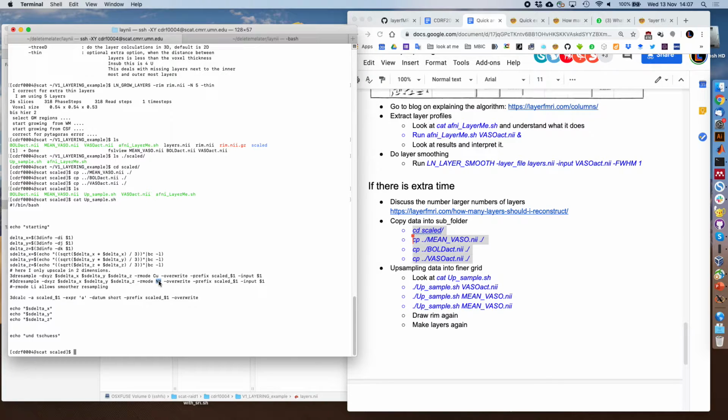I like linear or higher than linear interpolation functions. But people say that if you have that, then you might introduce wiggle or Gibbs ringing artifacts and put stuff into your data that might not have been there originally. So each interpolation function has its advantages and disadvantages. If your result depends on it, don't trust it anyway.